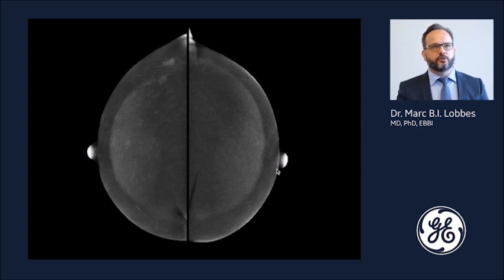So although the chances that you don't find any abnormality while you have an enhancing lesion are very rare, I think, at least in the future, there will be the ability, similar to breast MRI guided biopsy, to do contrast-enhanced guided biopsies with vacuum systems to also solve these kinds of problems.